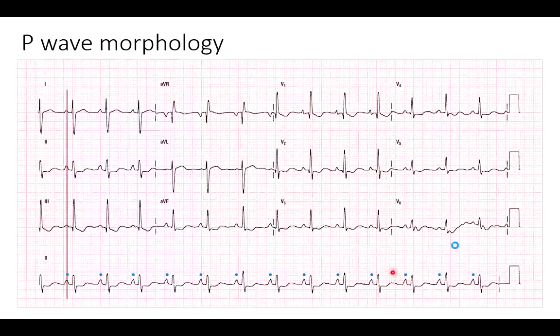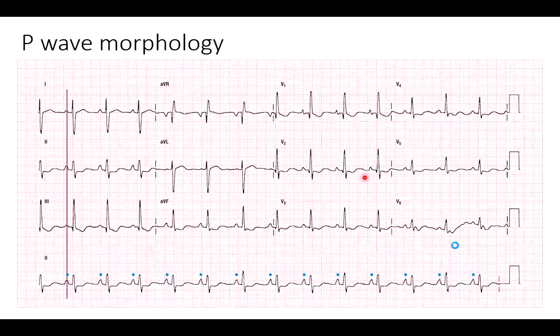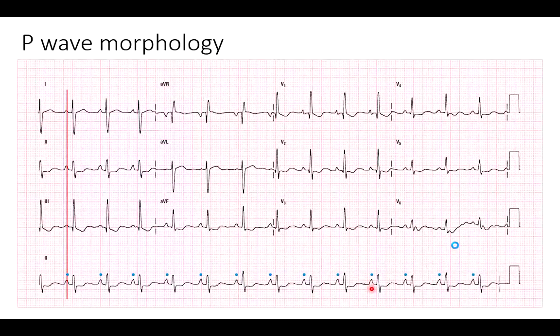In addition, if I see a bunch of bumps like this here, I might wonder, is this a negative reflected P wave? Or what's this little bump here? I'm not really sure. I could go to one where I'm confident. This is definitely the P wave. And I'm going to follow this up and I say, oh, no, that was the P wave right here, because it occurs at the same point in time as this one down here.